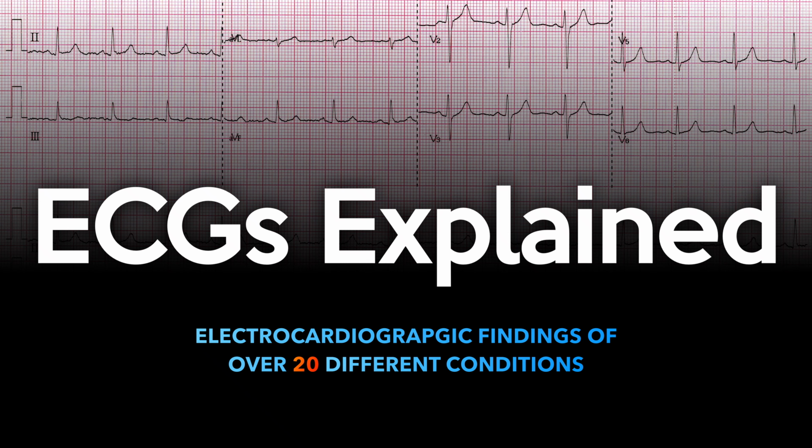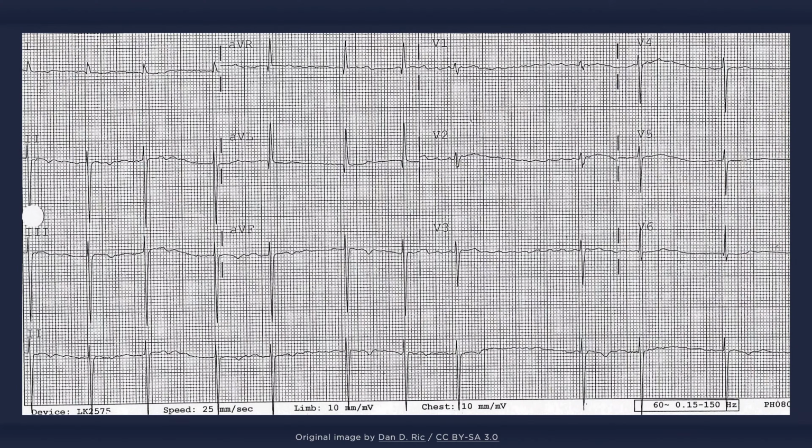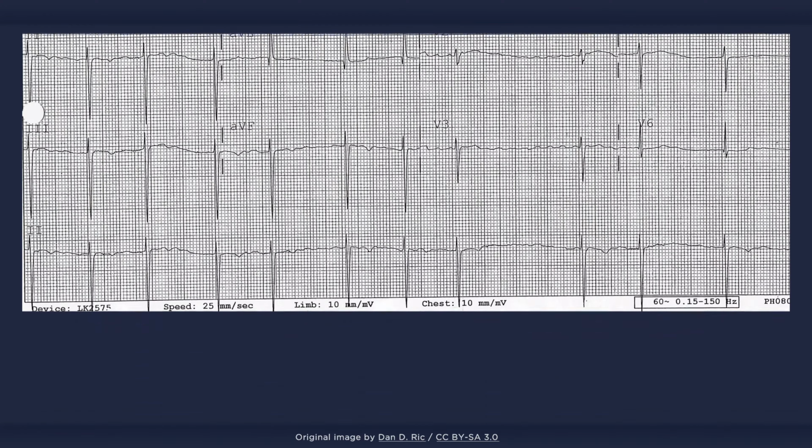This lecture will describe the ECG findings associated with over 20 illnesses and conditions, starting with atrial fibrillation. Atrial fibrillation, or just AFib for short, is the classic irregularly irregular rhythm. The atria transmit erratic and random impulses down to the ventricles, which simply put, results in a heart rate without any discernible pattern. To help describe the characteristic findings of AFib, we are going to focus on the rhythm strip of this ECG.